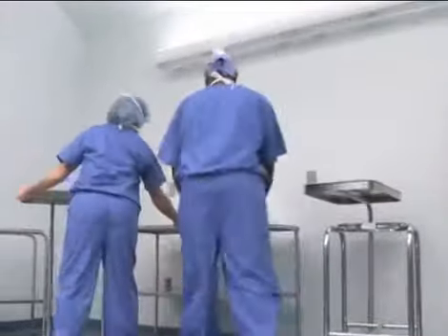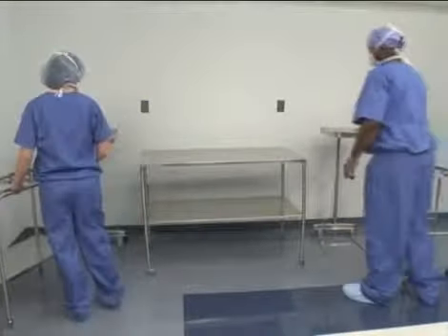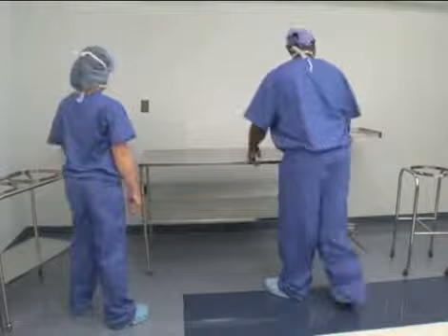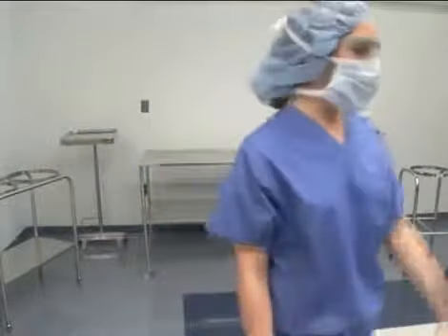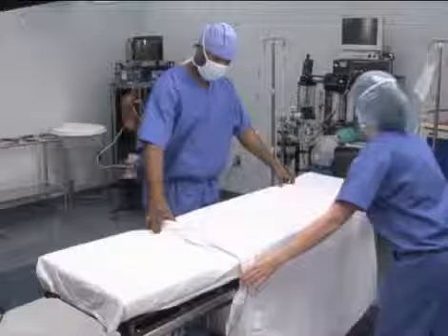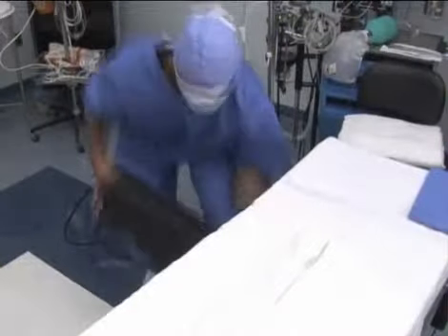Arrange the furniture in the operating room to accommodate the particular procedure being performed. Keep in mind, the room is arranged to prevent contamination of sterile surfaces by traffic and non-sterile equipment. Prior to the first case of the day, all surfaces are damp dusted before placement of equipment and supplies. Place clean linen on the OR table and be sure that arm boards and other table attachments are available in the room.